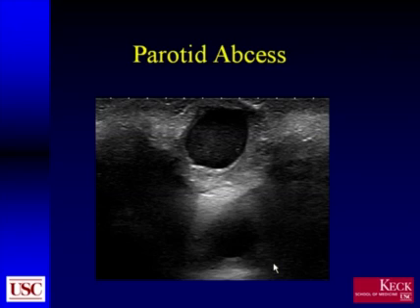Again, one of the complications that may occur in these patients is the development of an abscess. This is probably from a blocked infected duct, which then develops kind of a life of its own and enlarges. These typically present as a hypoechoic lesion, oftentimes with moving material within on grayscale evaluation and surrounding hypervascularity on color Doppler.